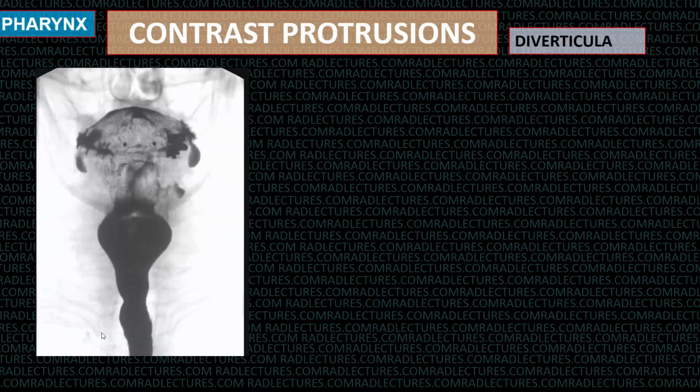There are the lateral pharyngeal diverticula, as I'm showing you here. It is high up in the pharynx. This is the lower border of the mandible. This is the back of the tongue, and this is the lateral pharyngeal diverticulum. The vallecula is here, epiglottis is here.